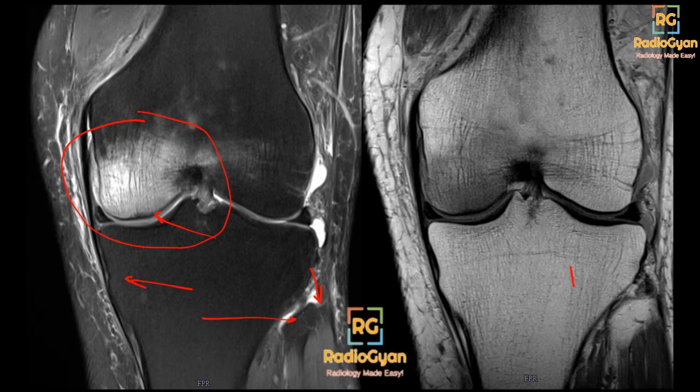So I'm doing this exercise because even for me it's very difficult at times to get oriented first. So what is lateral, what is medial? I try to get the orientation first, because there are a lot of pathologies which affect the lateral aspect of the knee. There are some which affect the medial. So this is one of those pathologies. This is lateral, this is medial.